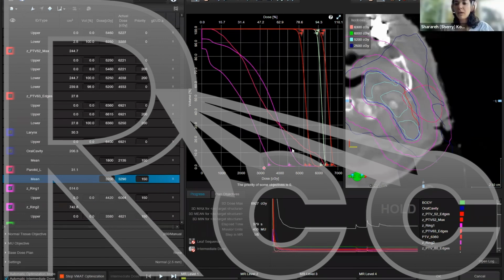Awesome. Thank you. Do you use NTO in VMAT breast planning? I do. So I optimize the exact same way for all sites, breast, head and neck. There are some extra things that you have to do with breast planning. Maybe we can have a tutorial on that. Hopefully they've been covered, but some extra little things for flash outside of the skin surface. But other than that, the same document works for every single site.